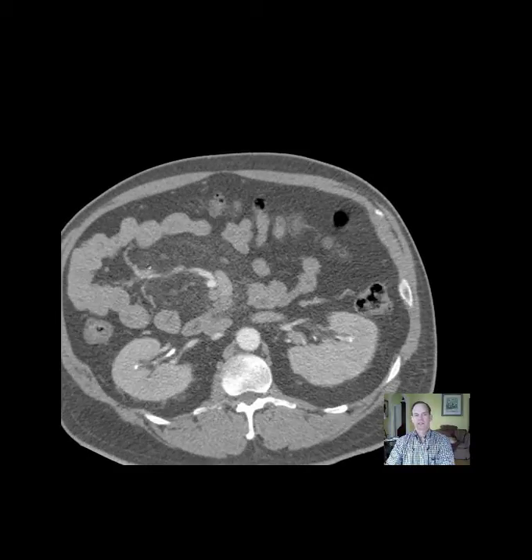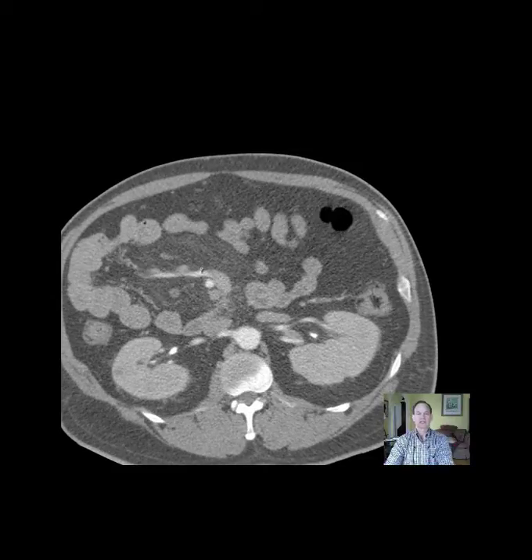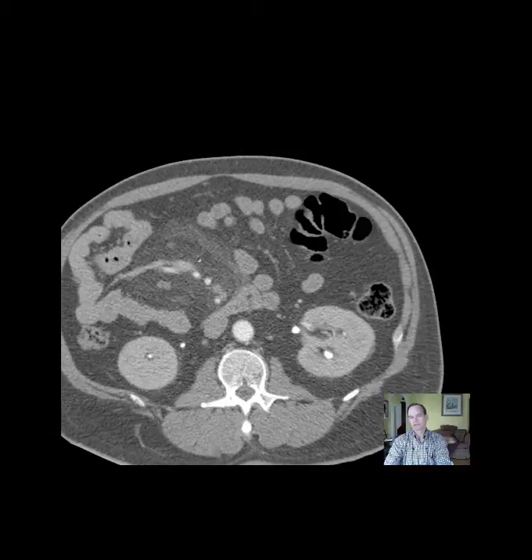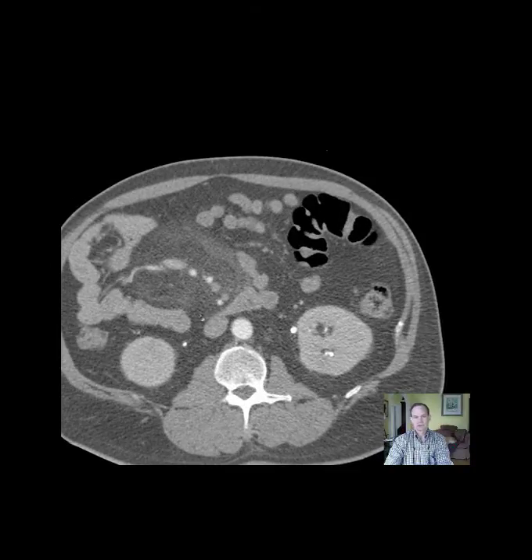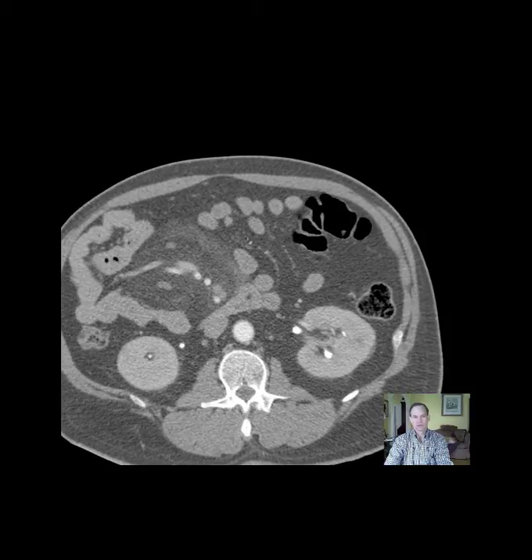We see the mesentery here, and here's bowel, of course, and you see the mesenteric vessels radiating out to it, and you see this misty appearance, this haziness of the mesentery here that you don't see right over here, for example. It's almost like you could draw a line right around it and say, okay, here it is here, this is abnormal here, this is all normal over here.